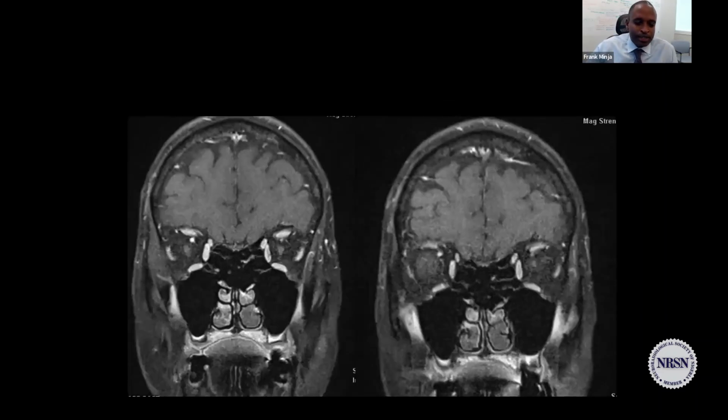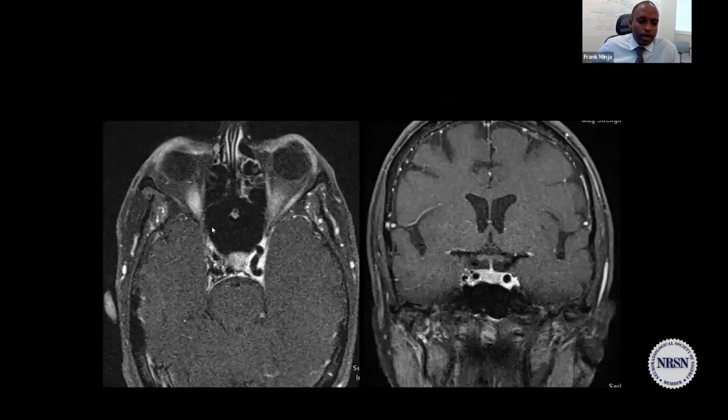So how are you going to see this, right? You're looking on a regular cross-sectional imaging, you see abnormal tangle vessels, right? You see all these little vessels in the right cavernous sinus. That is your dural AV fistula, right? You see all these little abnormal vessels in there, which we do not see on the contralateral cavernous sinus. This is how a normal cavernous sinus should be, right? You have a cavernous segment of the ICA, and then just a pool of blood in the cavernous sinus. What is all this tangle of vessels, right? That is your dural AV fistula. So this was an indirect cavernous carotid fistula.